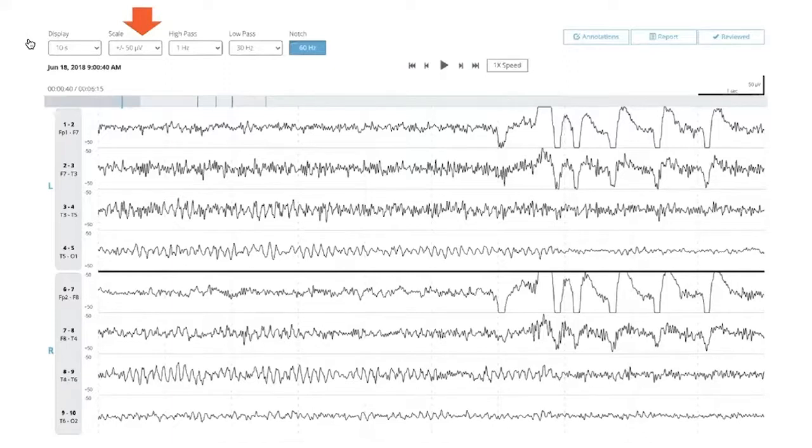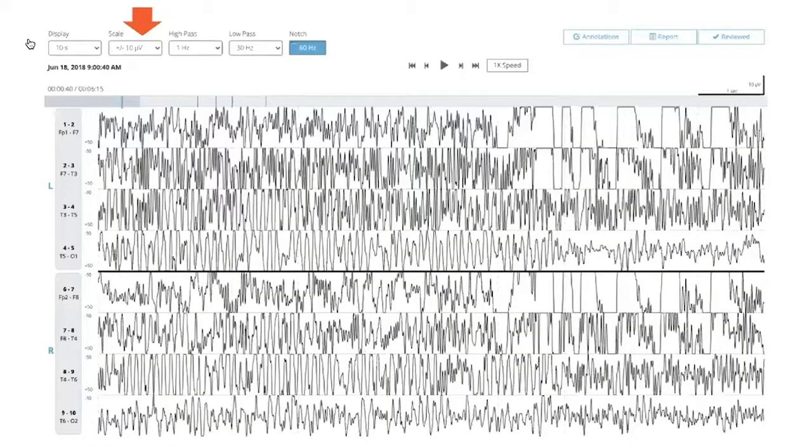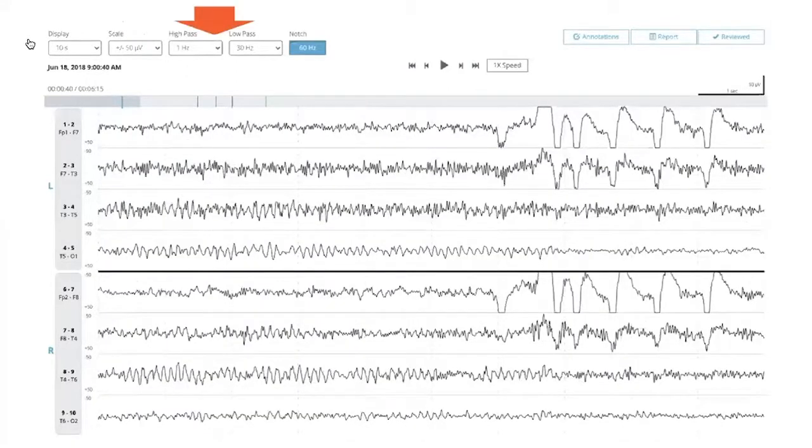So you have to make sure that you are playing with the gain in such a way that you are differentiating the shape. Here, you're just blurring the shape so much so that everything is very confusing. Now, the high pass and low pass, what does it really mean? Well, high pass means you're letting the machine pass the signal higher than a frequency. Low pass means you're asking the machine to basically show frequencies below that particular threshold.